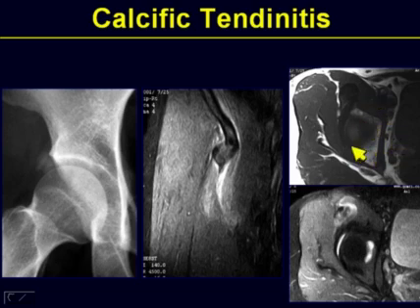Here you see the femoral head, the acetabulum, the anterior inferior iliac spine. It is not until you employ the T2 sequence for the fluid sensitivity that you begin to appreciate the edema, the abnormal fluid collection, and of course the signal void representing the calcifications in front of the hip at the origin of the anterior inferior iliac spine.